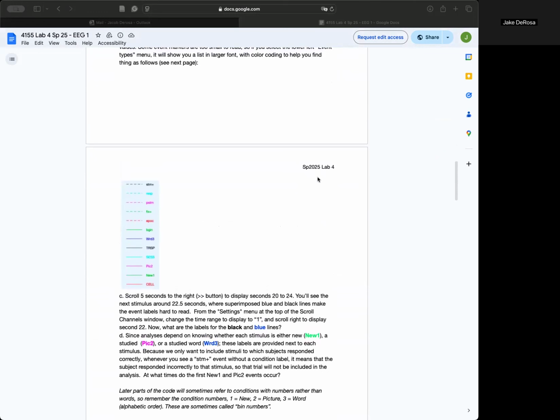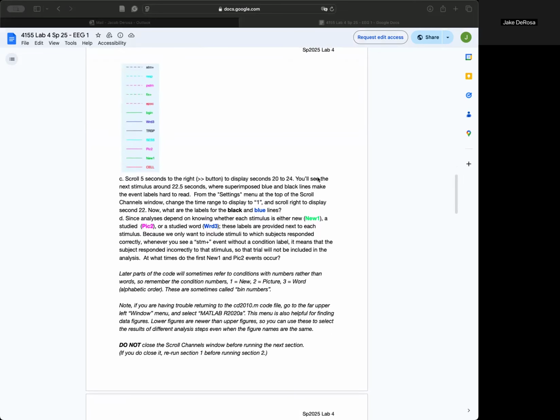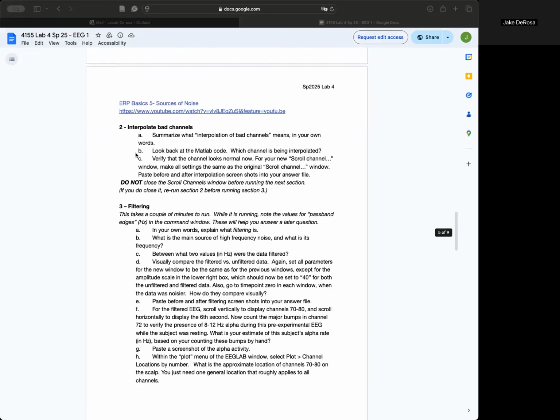So the first few questions, you're actually going to be interacting with the various steps of the script. So you're going to be running the various questions that are actually nested in the script line by line. And you could see, based on the various pop-ups that come up from the script, each of the different stimulus files are color-coded and correspond to some of the figures, which you're going to see right here.